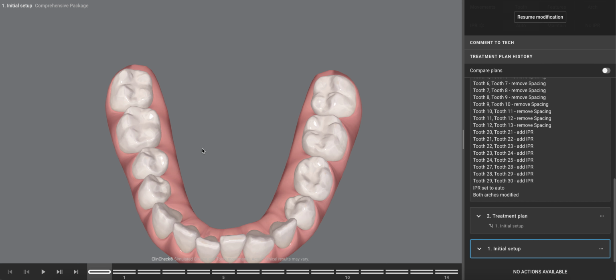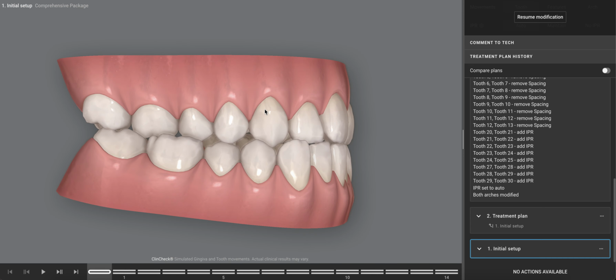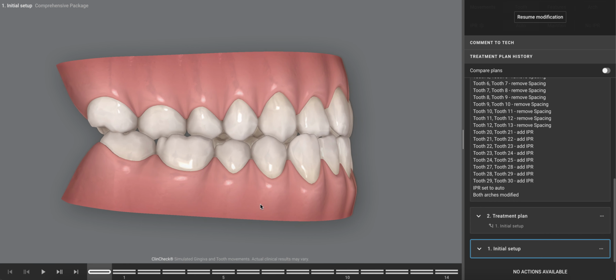So to paraphrase, mutually protected occlusion in a high-risk biomechanical patient is a good idea to try to explore and try to have that be your endpoint. But in a patient that shows low biomechanical risk, I don't know if mutually protected occlusion is necessarily the endpoint we need to go after. In this patient, that would be rather hard. So I'm going to spend a little bit more time on this, and I'm just going to call it MPO for mutually protected occlusion, so I don't have to keep saying that rather verbose phrase.